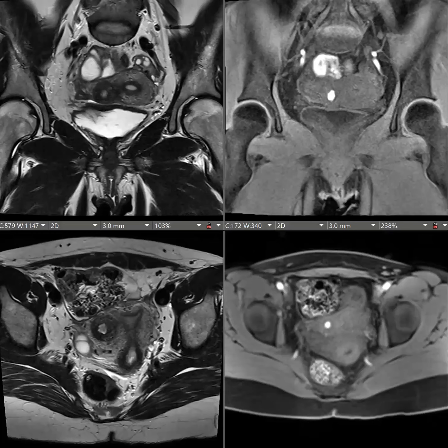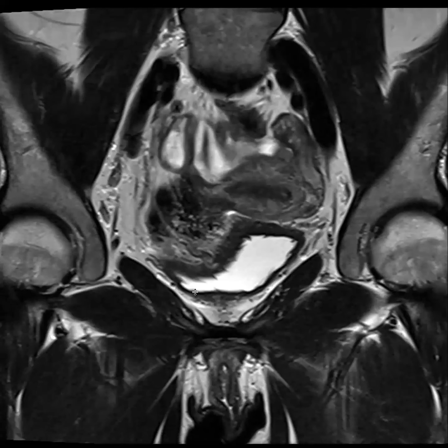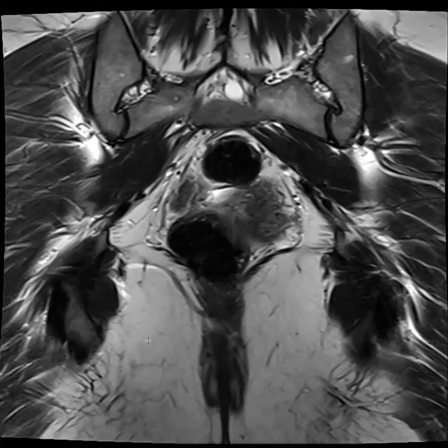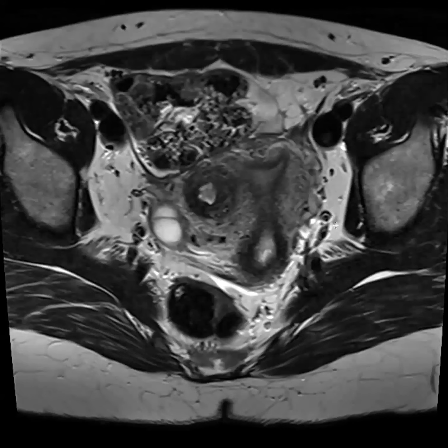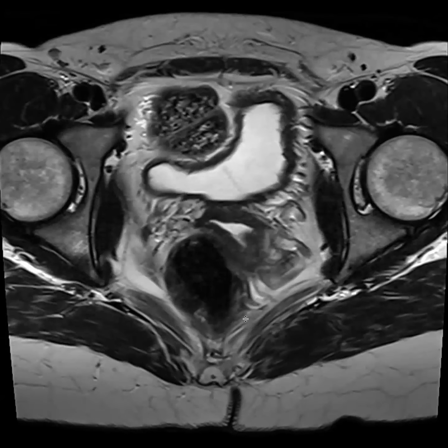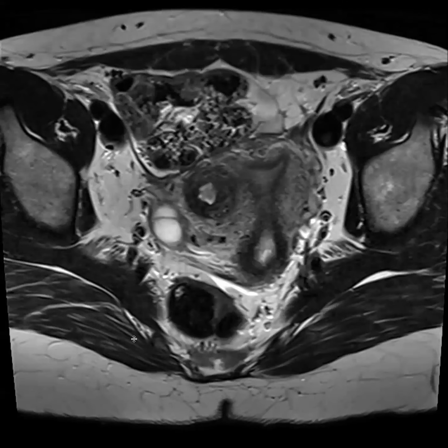Okay, this is a case from Cookie. So what do you think here? Here's a coronal MRI, and they give you the axials. So this is the uterus here. There's a bladder here. I see something in the kind of cornual interstitial area right there.